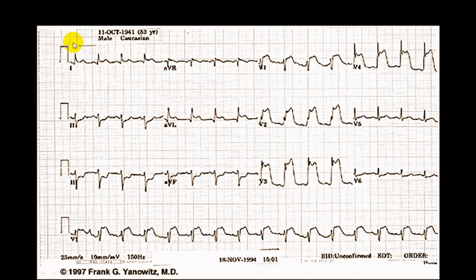Now you can see here, in this ECG, rate wise, this is tachycardia. All QRS complex is preceded by P wave. QRS complex is narrow. P wave is upright. PR interval is constant. But if you see in this ECG, there is an ST elevation in lead 1, AVL, V1, V2, V3, V4. Also slight elevation in V5. This is an anteroseptal infarct, anterior wall with septal wall infarct.